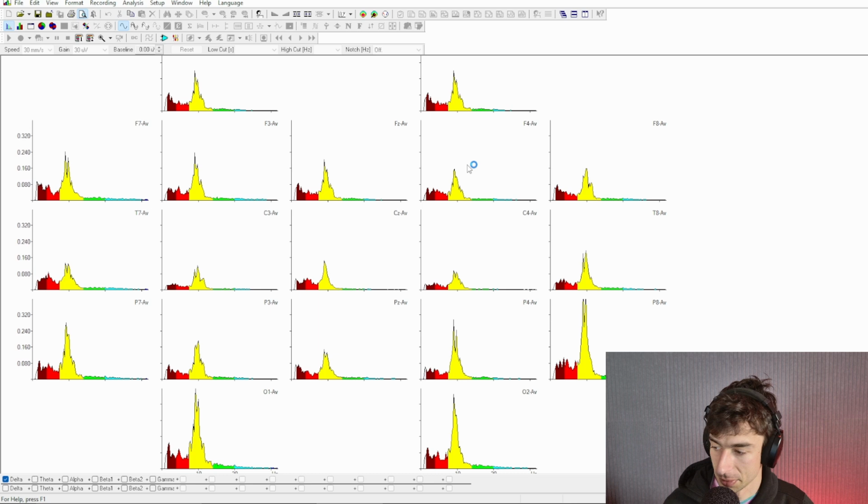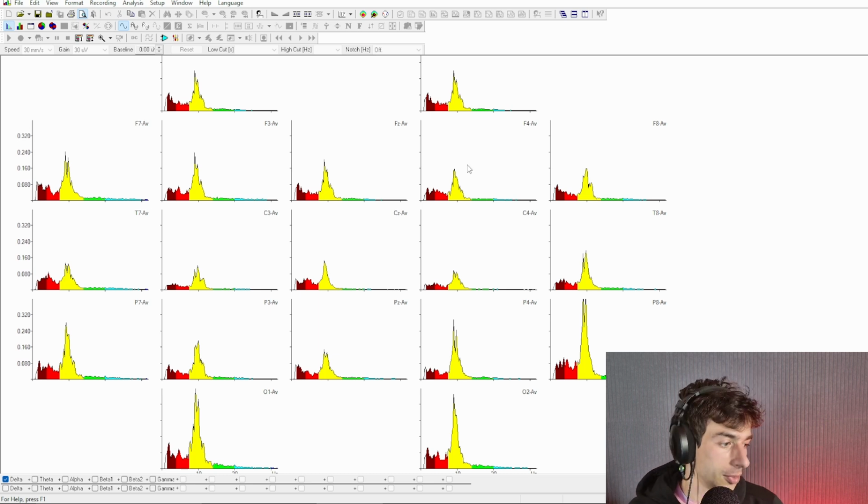And we're going to generate our print preview here. The first time we do this, it's always kind of slow.